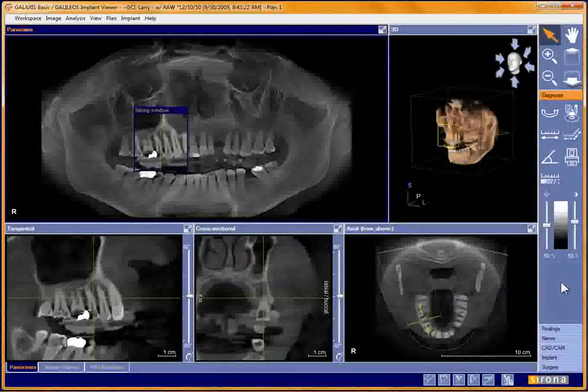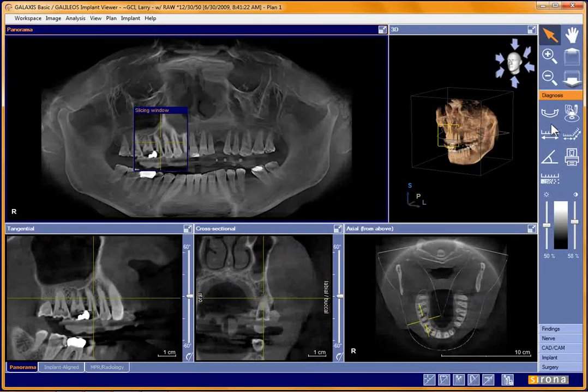Some of the other tools that we have in the diagnostics tab, other than adjusting the panoramic curve, is to create a wrap and go viewer CD. This allows you to create a viewer disc for someone to view, just as we'll be showing in this class and in further classes, anything that does not require a license. We'll go into some tips about how to create these viewer CDs and how to help your people who receive those to use this program better.